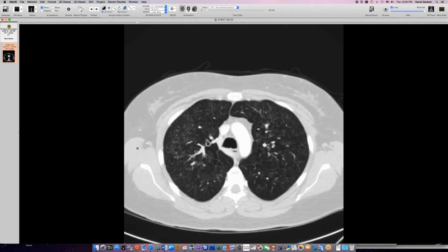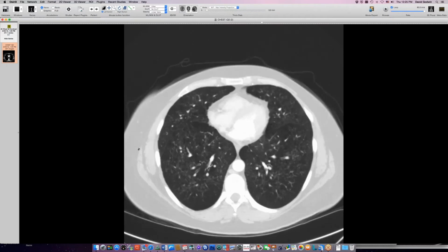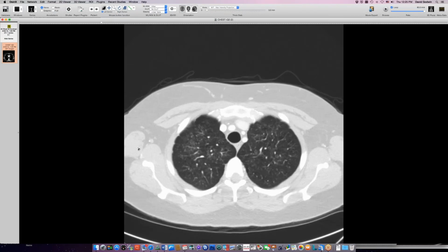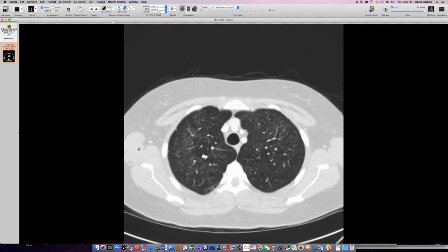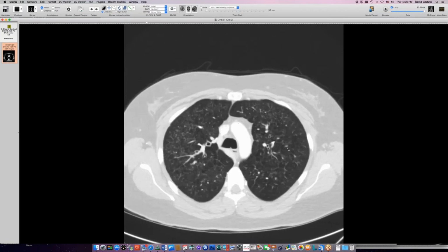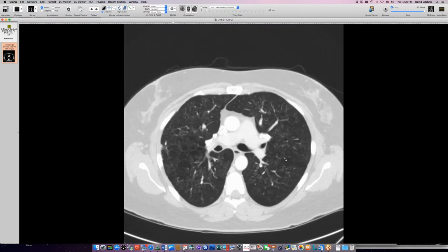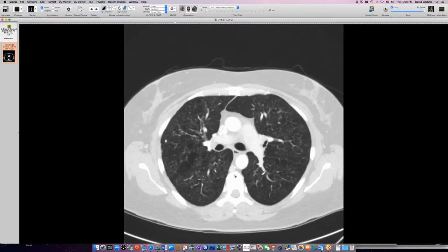So this is her kind of lacy pattern of lung fibrosis against a background of emphysema. So upper lung predominant, not peripheral, but sort of lacy looking, with a little bit of peripheral sparing lung fibrosis here, combined with emphysema. So here's the biopsy site up here in the right upper lung. So what do we think, guys? This was Langerhans cell histiocytosis.